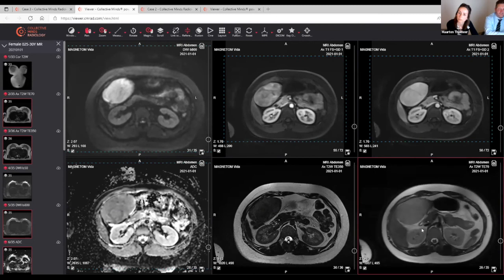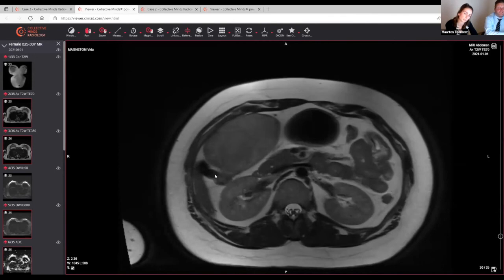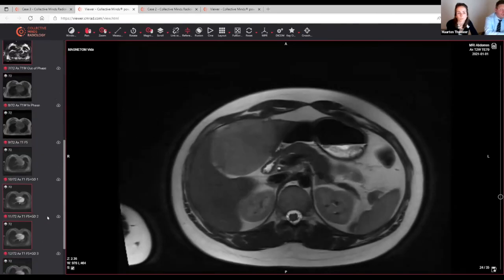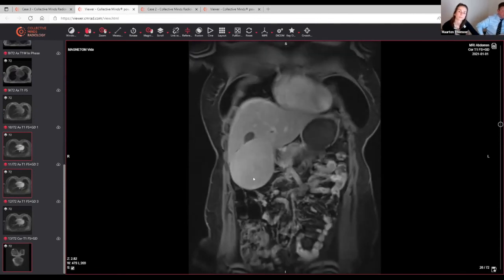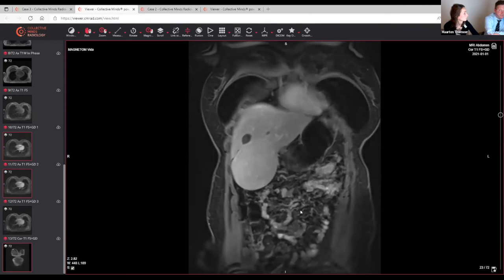And then the lesion is also heterogeneous on T2. You saw it in the lower compartment, there were some hypointensities. Some parts were different. Because the lesion is quite heterogeneous, and because it was quite easy to resect, below segment 4, we proposed a resection, and that's what they did. The result of the resection was an inflammatory adenoma. That's what we would expect, because there is enhancement in the late phase and hyperintensity on T2, all typical aspects of an inflammatory adenoma with sinusoidal dilatation.